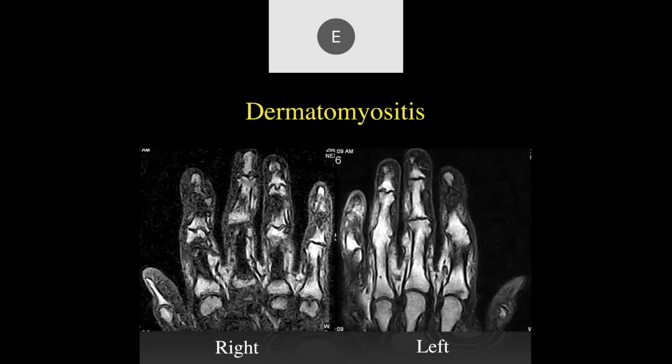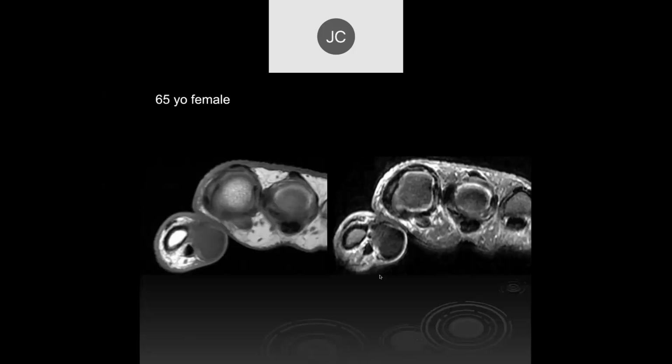Yeah, this was a patient who had dermatomyositis. Okay. Yeah, so there are a number of inflammatory diseases which can affect the skin and the soft tissues in the joints, and dermatomyositis is one of them. Scleroderma, dermatomyositis, psoriatic arthritis.